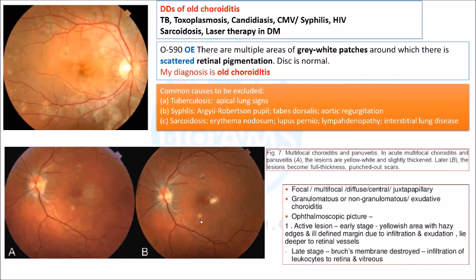Look at the choroid. There is a white spot. Okay. Beside the macula, there is a spot. Can you see, Mahbub? Another colleague, please. Yes, sir. Rafid, Dr. Beg, the side also. In the center, beside, yes, I can see. This area is not much clear cut. Okay. There is some pigmentary area. There may be again a pale area. Subsequently, change happened and the disease progressed. You see, this spot is becoming clearer and this spot is also almost clear. Can you compare this?